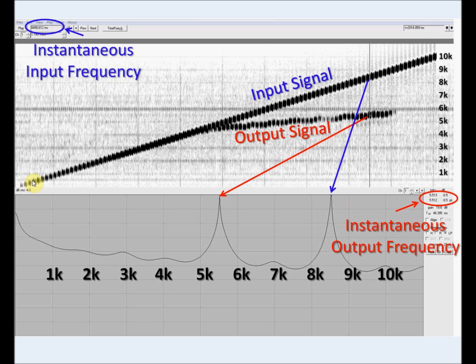The x-axis is really a time axis, but as you can see, the test signal progresses in frequency at a rate of 100 Hz per 100 milliseconds. So at 1 second, the test signal is centered around 1,000 Hz. At 2 seconds, it is centered around 2,000 Hz, and so on. This allows us to substitute time for the input frequency.